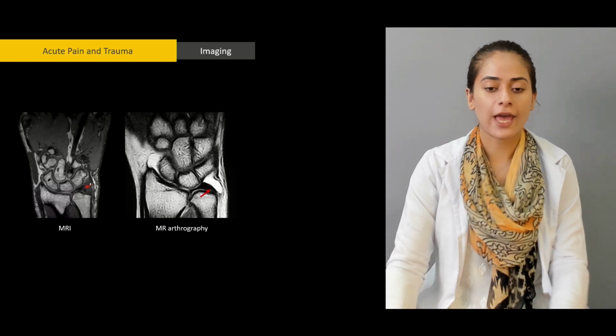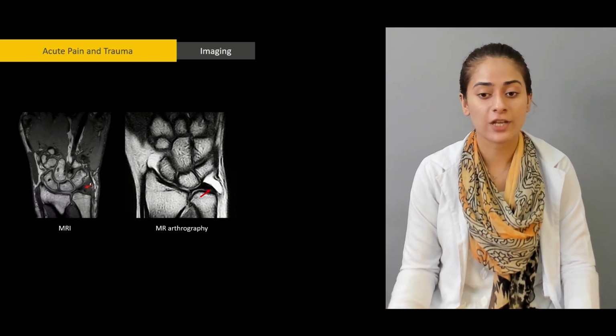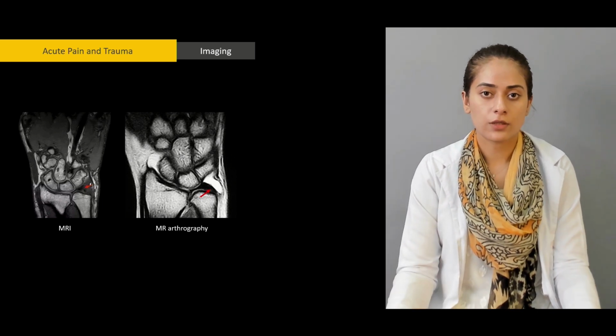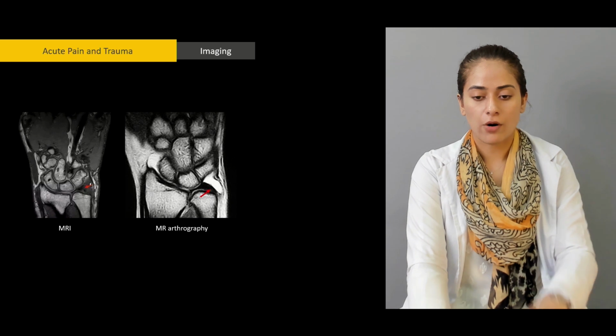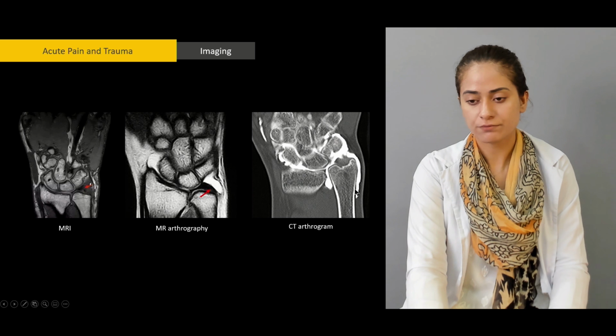You can't just look at a radiograph without knowing the history of the patient or the presenting complaints of the patient and give your diagnosis. So it is very important that you know the history, you know the presenting complaints, and then you look at radiographs to have a better understanding. So these 2 are MRIs. Then we move to a CT scan. So this is a CT scan.